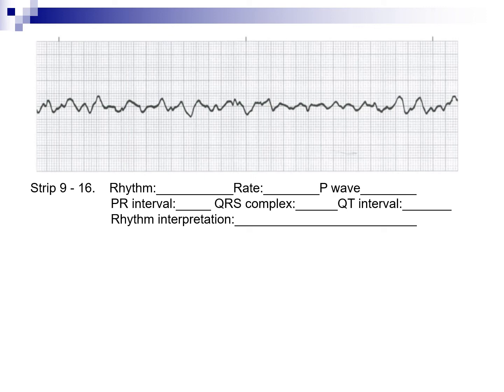It's a coarse waveform. And again, when you see this, this is not something you would waste time measuring or anything. You're going to act quickly, check your patient, check a pulse, call for help, start CPR until the defibrillator comes, and defibrillate this patient as soon as possible and resume CPR immediately.